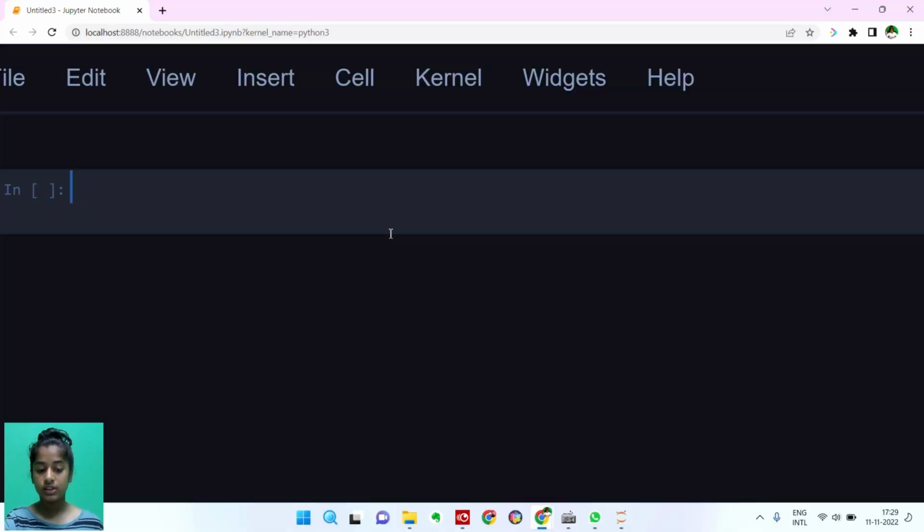What's up guys, welcome back to my YouTube channel Code to Create. In today's video we're going to classify the brain tumor, if the person has brain tumor or not. And based on the X-ray images of our brain, we're going to classify this. So let's get started. We'll first import the necessary libraries.